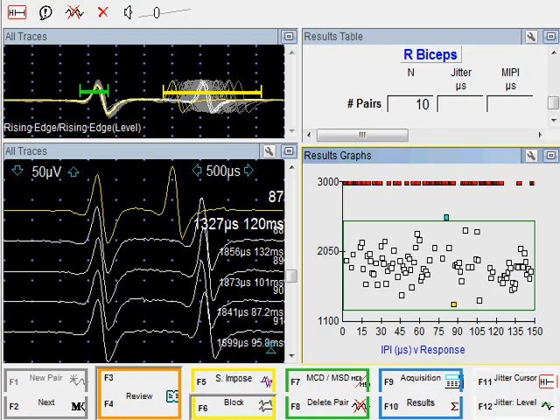So you can look at very long intervals, very short intervals very quickly. If I wanted to exclude this trace from analysis, I can click on it. It is now excluded. Notice the blue color over here. If I want to exclude this trace, click on it, it became blue in color. I can re-include the traces in analysis and so forth.